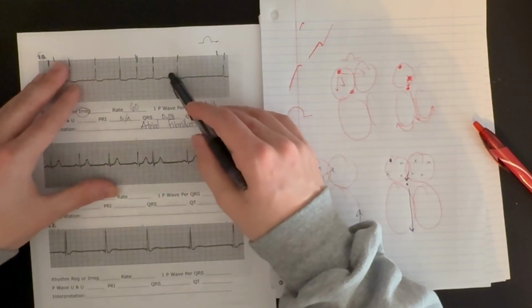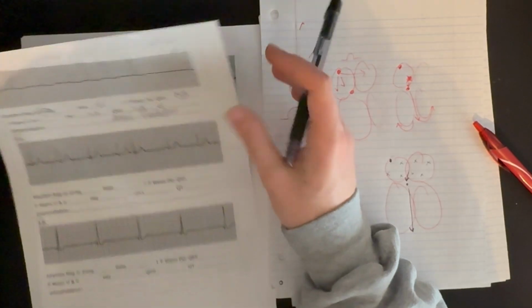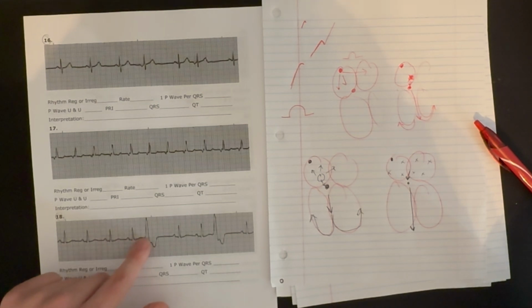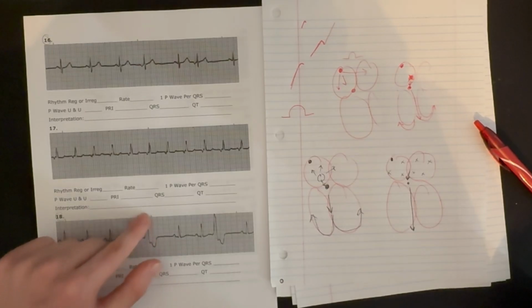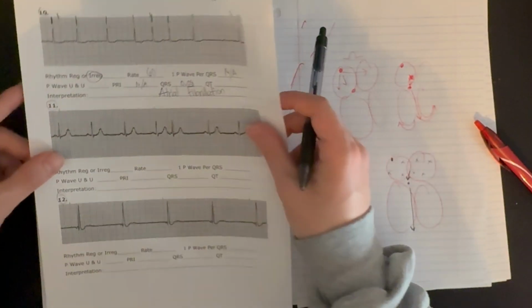Or do we have a very wide QRS complex, which you can actually see right here, a very wide QRS complex with no P wave, meaning that this beat started in the ventricles. And so that impulse had to slowly move through the contractile cardiomyocytes in the ventricles, causing depolarization until it got through the entire ventricular tissue, rather than taking that very good conductive pathway and happening very quickly.